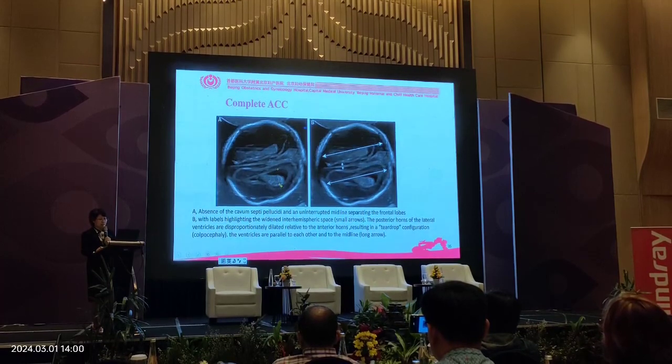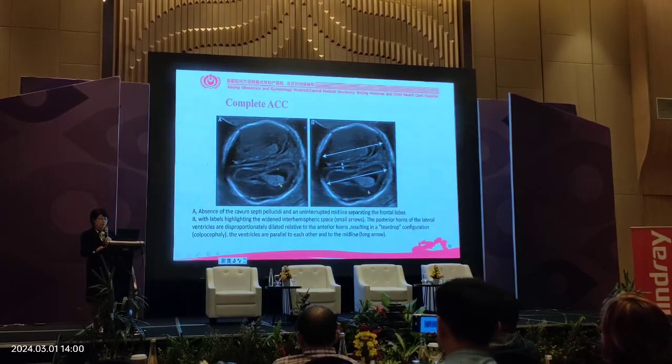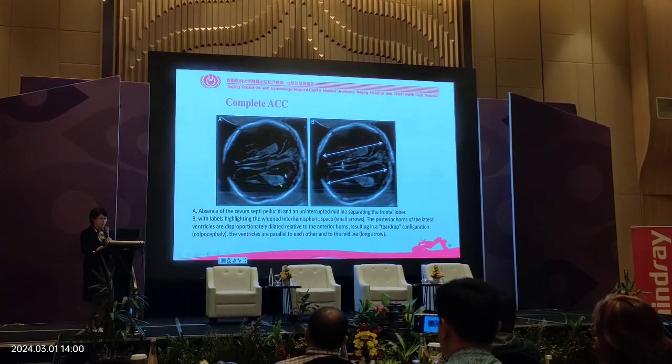So for these structures we get the mark of a teardrop-like configuration. So it's an indirect sign for complete ACC.